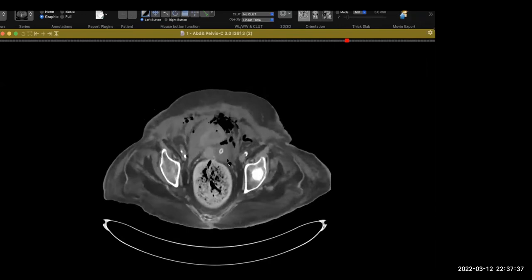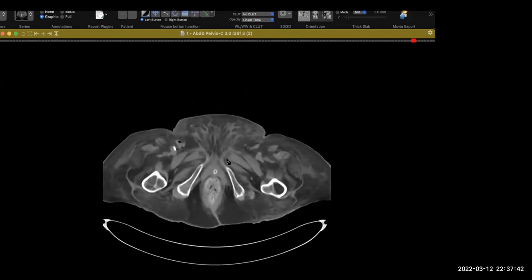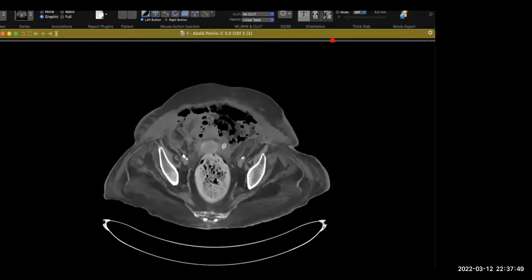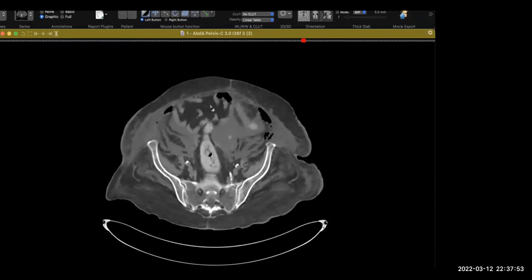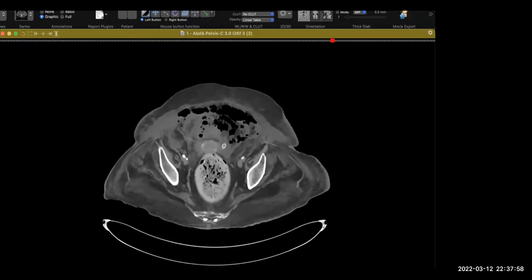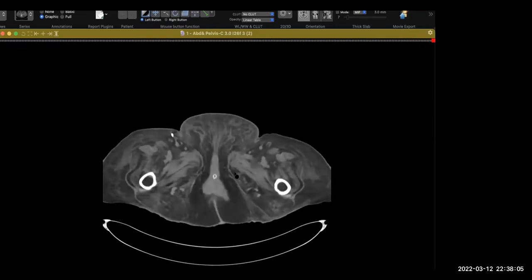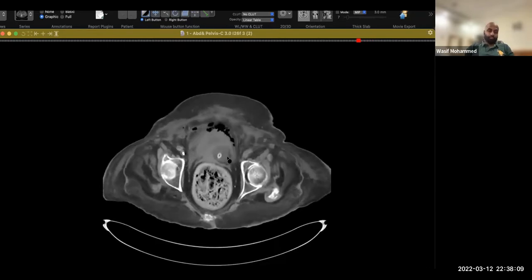So I can see there is, okay. When I came to the area of the pelvis, I can see that there are a lot of air foci, intraperitoneal air within the abdomen, and most of them are within the area of the pelvis. I don't know if the patient had any trauma. I'm just looking at the bones also. No history of trauma. Okay.